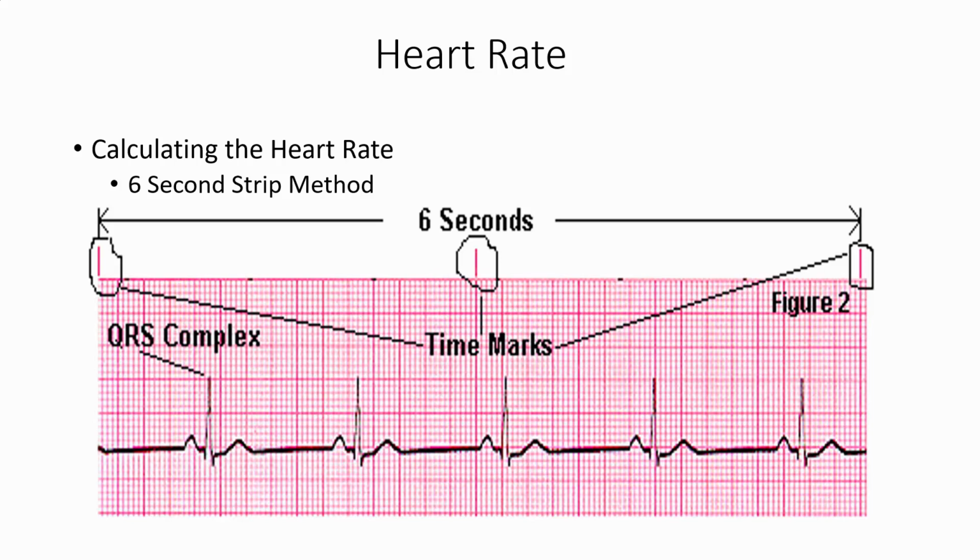The third step, remember, you're looking at your P waves. So here are our P waves right here. 1, 2, 3, 4, 5. And when you're looking at those P waves, remember the things you're looking for is you're making sure, do all my P waves look similar in appearance? And when you look at this one, you see that yes, my P waves are similar in appearance.